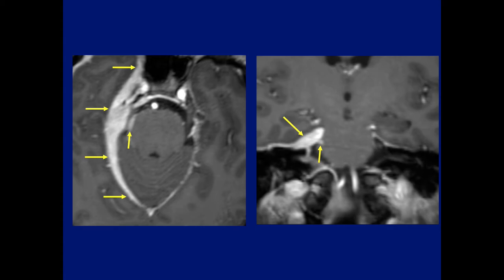Now, this case gave us a lot of headaches for a while to try to come up with a diagnosis. Any suggestions here? Correct.